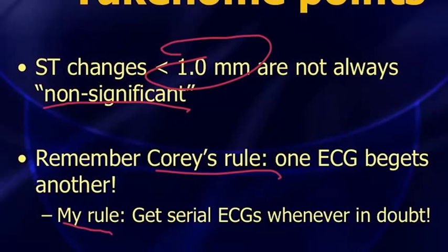Well, lead AVR gets no respect, but I hope you respect lead AVR, because when there's ST elevation in AVR in the setting of a person with symptoms, you've got to really, really worry about left main disease or triple vessel disease or proximal LAD disease.